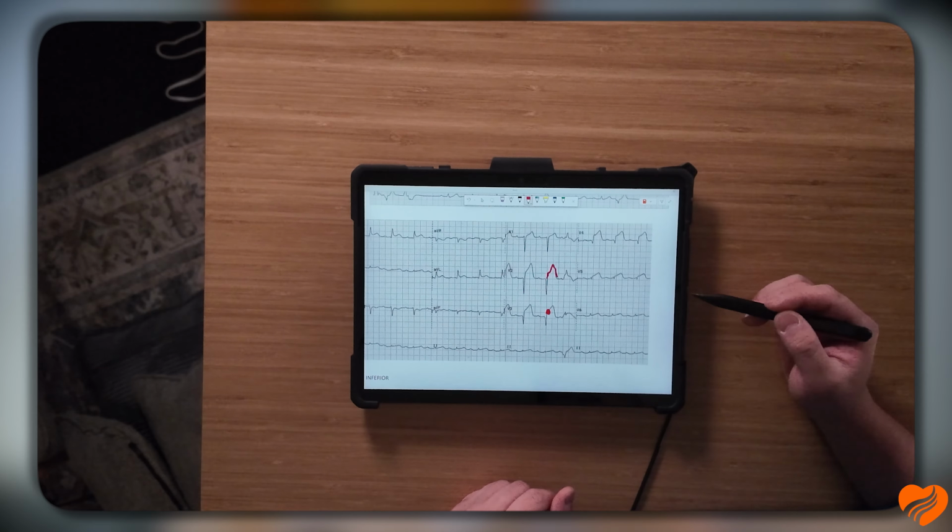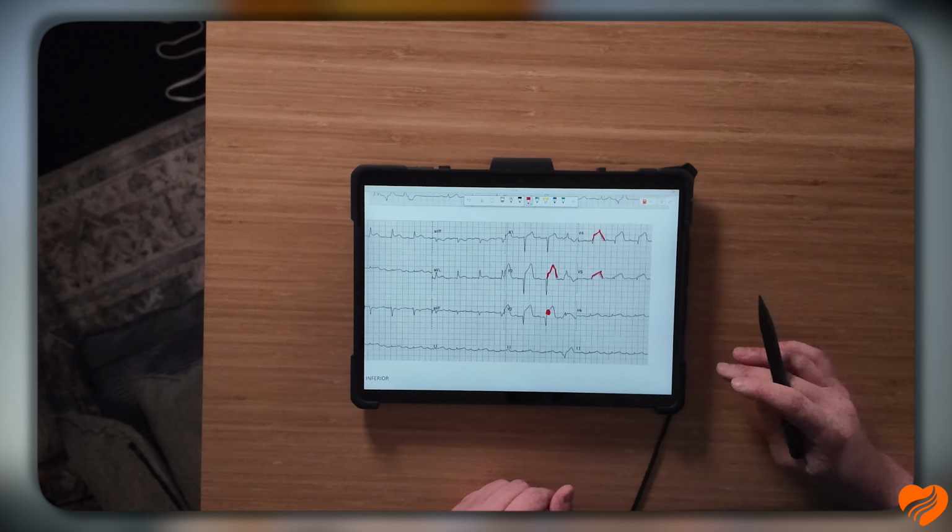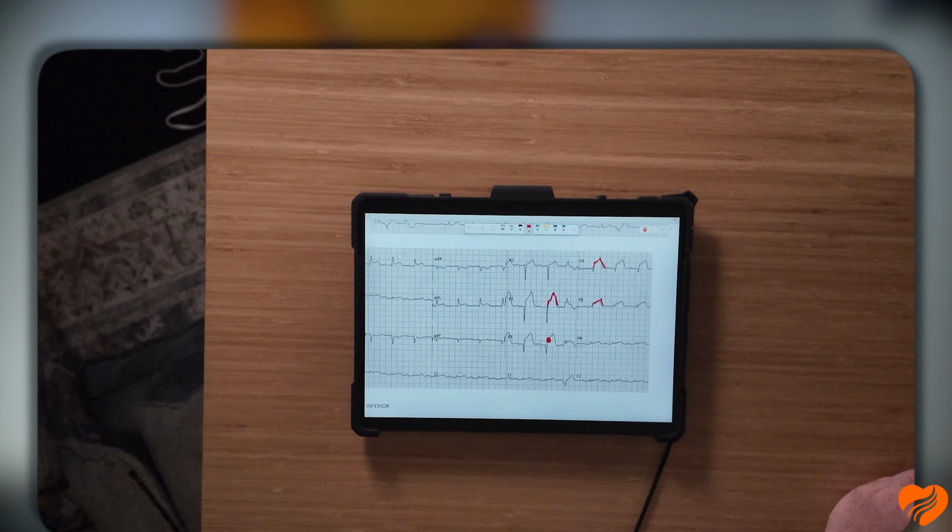So this is the same patient, okay? But now look at their anterior leads. We have massive, obvious ST elevation right here. Okay, look over here, huge, very noticeable. All right, so if we did serial 12 lead EKGs, good job, you just saved this guy. Probably not, but that's okay. Okay, so that was our anterior encroaching on our lateral leads right there.